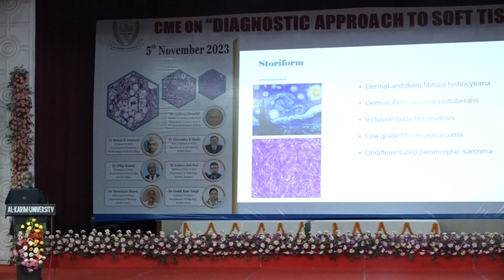So one was age-based differential diagnosis in your mind. Second was location-based differential diagnosis in your mind. Now the slide is under the microscope. You are examining it. You are looking at the cell types. You are looking at the stroma. And now try to find out what patterns you are finding in these tumors.